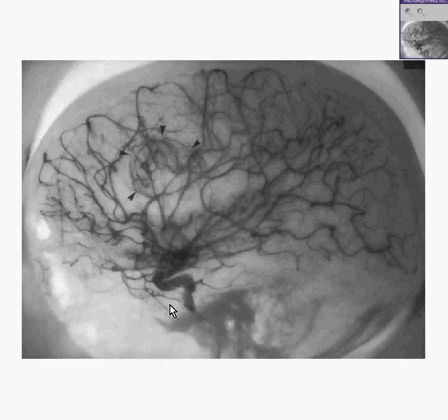Here's another X-ray. Only in this case, it's an angiogram. You could basically see the cerebral arteries fanning out. You can see the base of the brain here. Here's the carotid, internal carotid making its turn. Here's the area of the circle of Willis. And notice there is an area in which the blood vessels appear to become increased to feed this tumor.